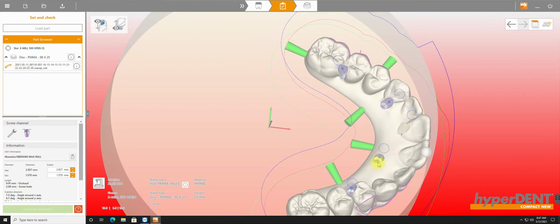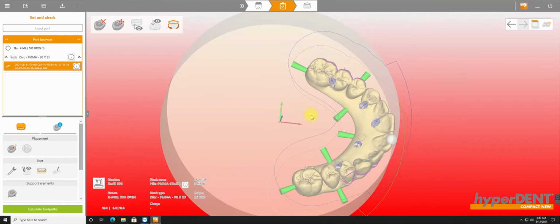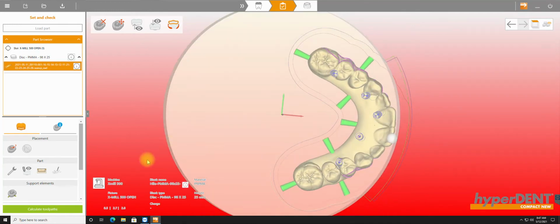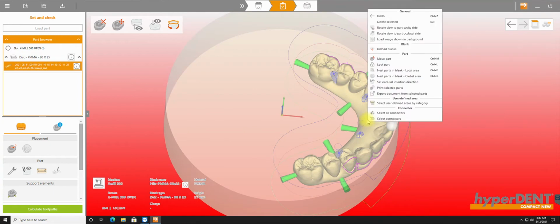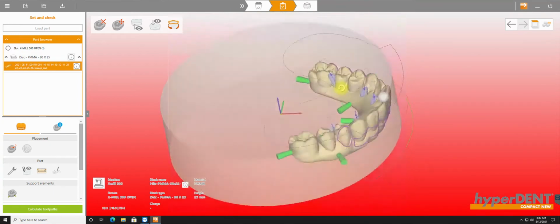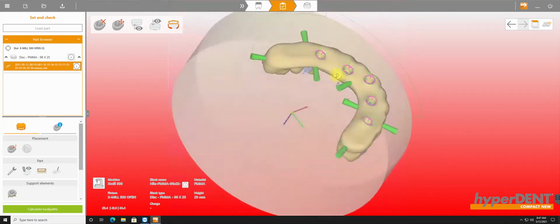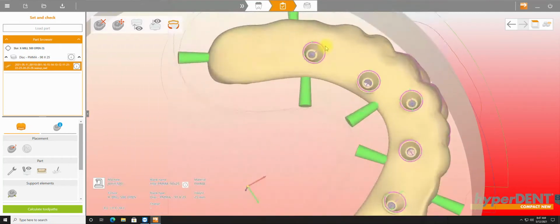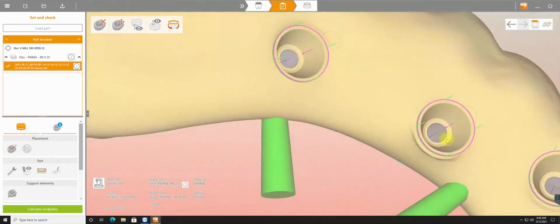They look like they're marked correctly. This case was calculated already, I believe. And let's see here if we can show it in the toolpaths. Alright, so it's already been unlocked. So we're going to go back and just double check this. With the Powerball cases, it's imperative that we just double check where the screw channel from the occlusal stops.